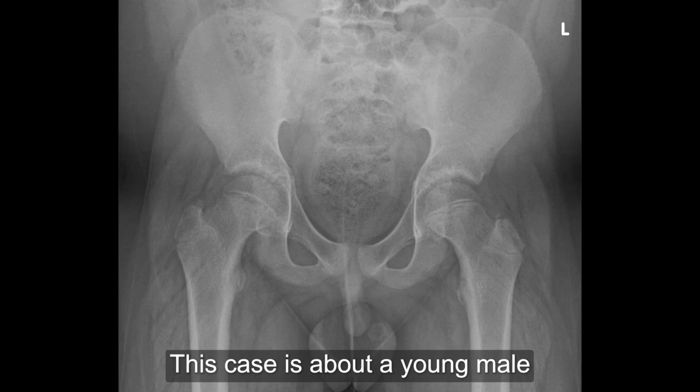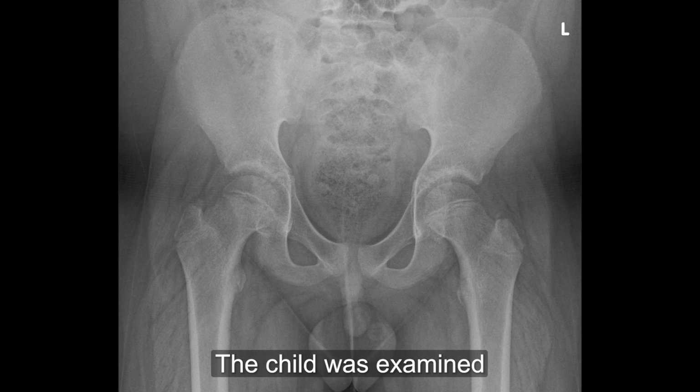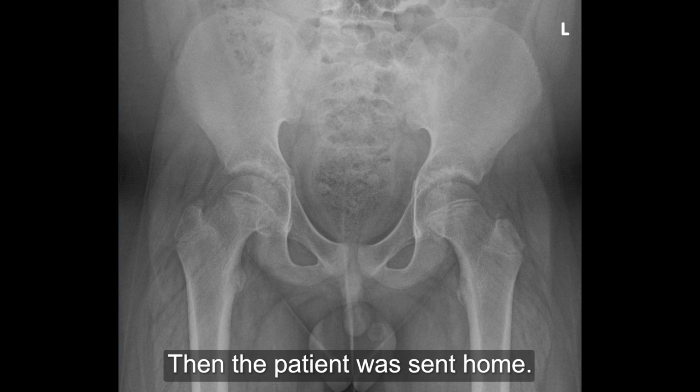This case is about a young male child, 13 years old, who came to A&E with right hip pain. The child was examined by the registrar on call and also had a radiograph because of the presenting pain on the right-hand side. There was no history of trauma. This was examined and deemed normal, then the patient was sent home.